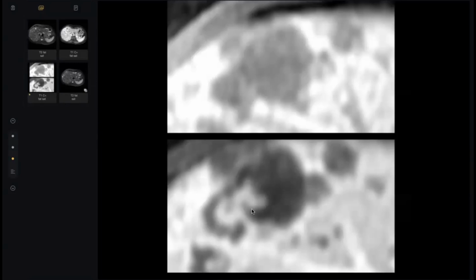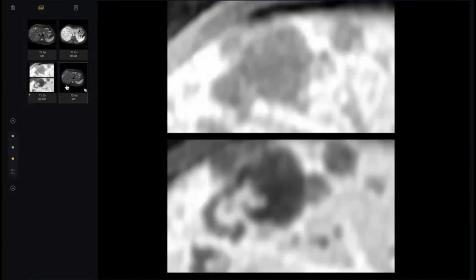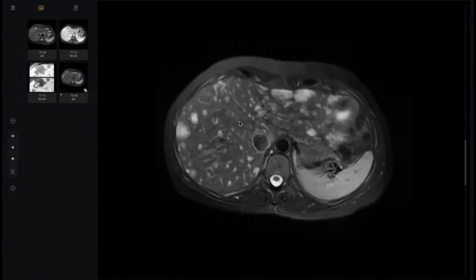See, post contrast, there are enhanced nodules here. Here it is, this one, but after magnification, this one. Give me another differential diagnosis. Biliary hamartomas. Yes. Biliary hamartomas have a bizarre shape, multiple, variable size with no definite shape, and you may find this enhancing nodule inside it, not connected to the biliary tract. You can put metastasis in the differential.